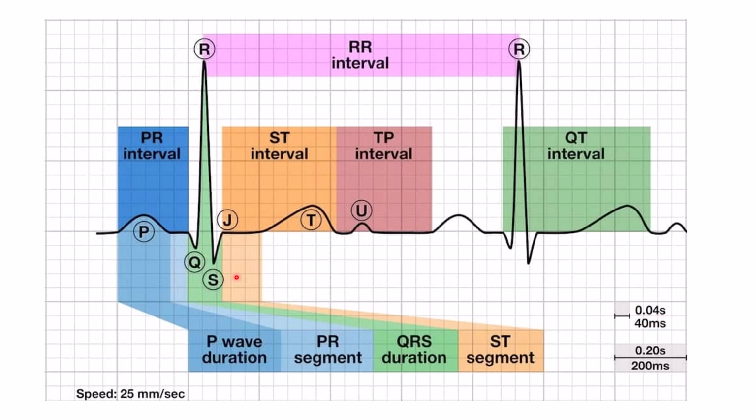A normal Q wave will have a depth of less than 2 millimeter, with a duration of less than one small square of 1 millimeter, and less than 25% amplitude of the following R wave. So in a small Q wave, you should note that the depth should be less than 2 small squares and the duration less than 1 small square.